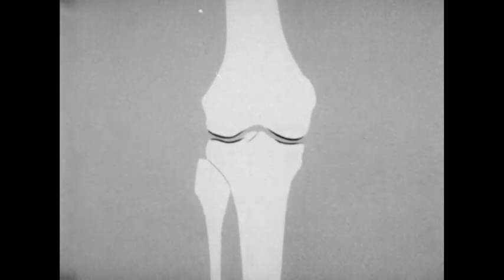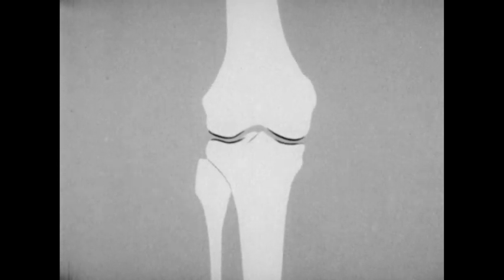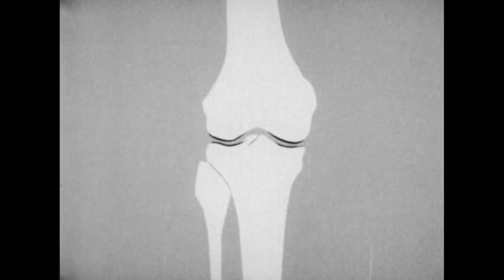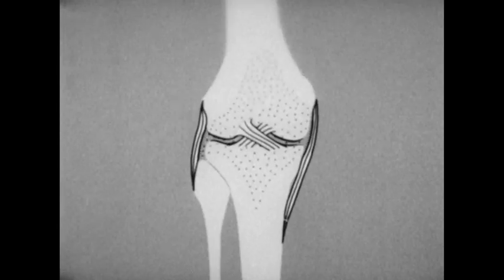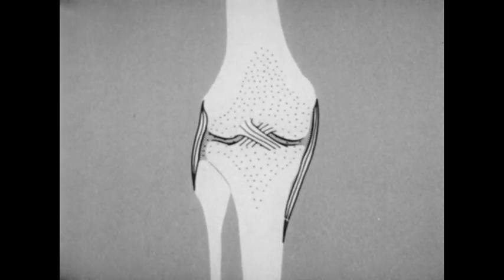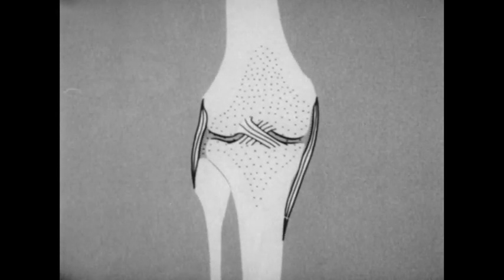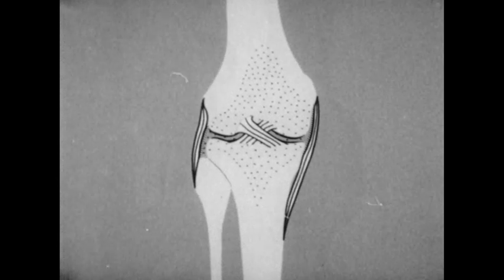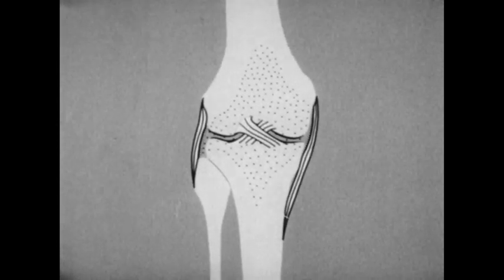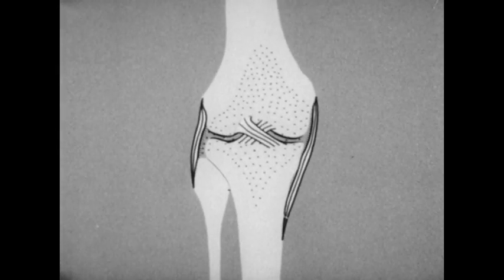The tibiofemoral articulation is essentially 2 joints, with the 2 convex condyles of the femur articulating with the 2 concave condyles of the tibia. Because the tibial concavity is very shallow, maintaining the knee joint at rest and in motion depends upon the surrounding articular capsule, the ligaments, and muscles. Also helping are 2 wedge-shaped semicircular fibrocartilaginous menisci. They are thicker laterally and posteriorly.